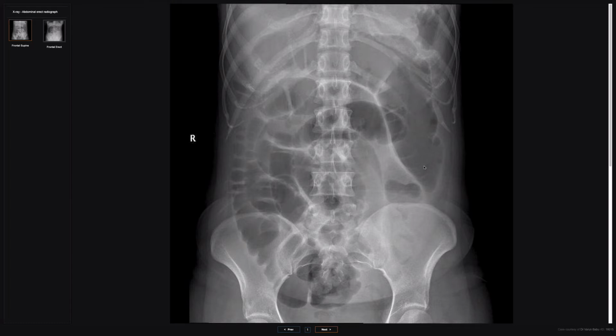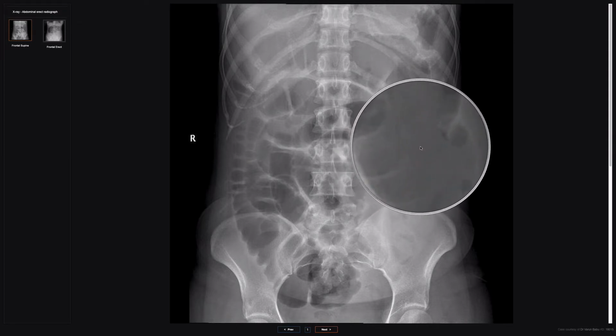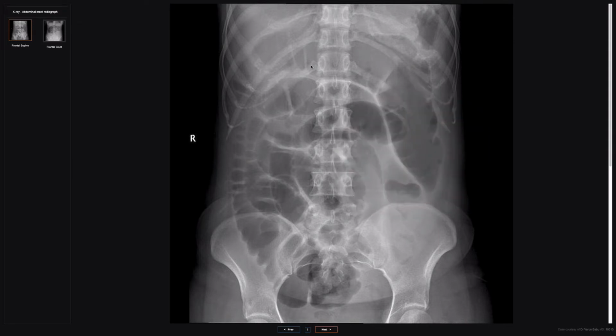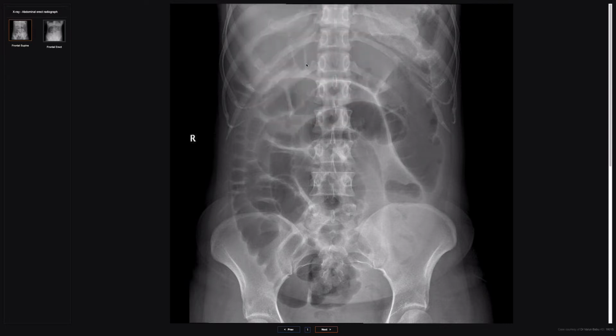And if you look at the folds, we have lines that run part of the way across the diameter. Okay, so these run part of the way, not all the way across. So those are the haustral folds. They're different from the small bowel valvulae conniventes, and they differentiate small from large bowel. And the large bowel frames the abdomen, so lies around the periphery of the abdomen.